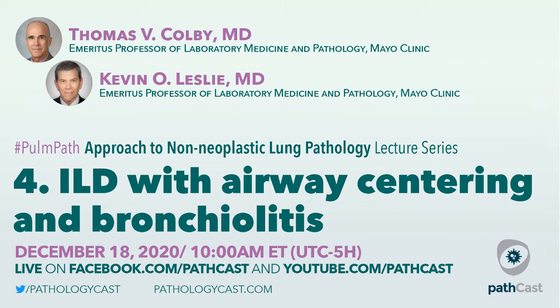The second point I wanted to make about peribronchial metaplasia is if you're in doubt because you have tremendous peribronchial metaplasia, you can always do a P40 or a P63 immunostain, because these things light up with all the basal cells being positive, very helpful in addition to cilia.